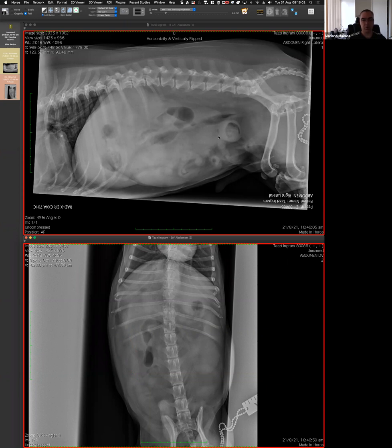So perfect. And now the idea will be to see what the others, first, how they react to your findings, and the same thing that you've done, if they agree or disagree, or they help you move forward, or say, no, you are reading something really wrong, and we go backwards again. I see exactly what you mean.